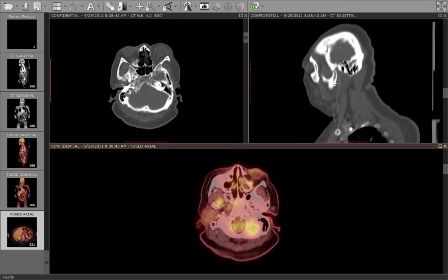There. Okay. So some patients have chronic or recurrent dislocation. This is, again, not a dislocation because it's not in front of the articular eminence. It's just translated down. And some of the treatments for chronic dislocation or recurrent dislocation, a couple things you can do. You could make this eminence longer so that it's not possible for the condyle to go in front of it.